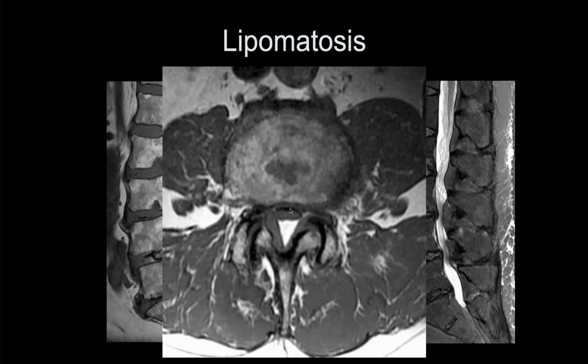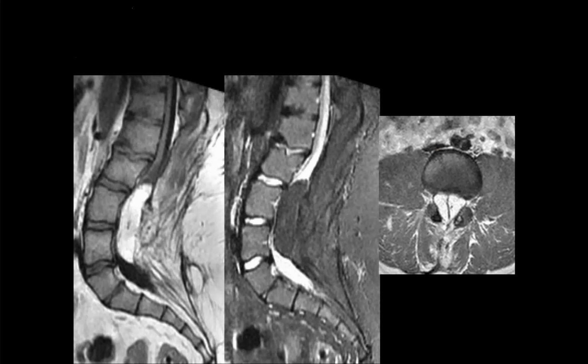And you can see how it can actually help produce central stenosis, and in this case, put tension on the nerve roots. Okay.